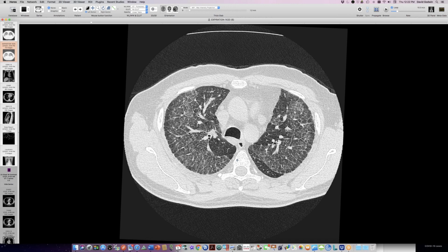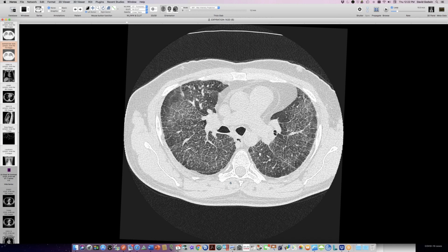It was not alveolar proteinosis. It was PAS stain negative. They just got, I think, normal cell counts. I don't think there was an abundance of any particular kind of cell. But you mentioned storage diseases a minute ago. I came in late, but Peter was showing that Niemann-Pick case. What do you think about that as a possibility for this? I really need help from you guys for figuring out what this is.